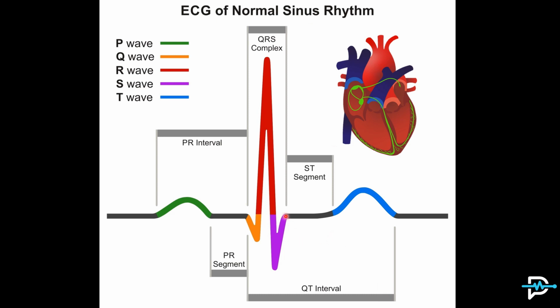The last big thing I'll measure here is your J point, which is right where this cursor is. It's the very end of the QRS complex. It's the beginning of the ST segment, and it's where we care about measuring for ST elevation, which we'll get into later. But that's the last big point on this slide that I want to reiterate.